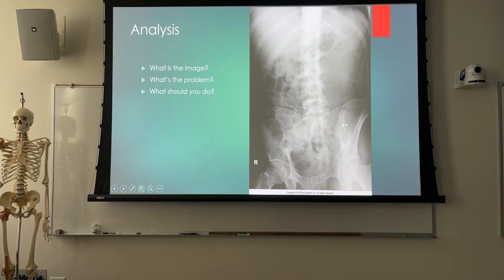We look at the pelvis, and in the pelvis we can look at a lot of different stuff. We can look at the obturator foramen. The one on the side closest to the image receptor, where we're rotated towards, will be scrunched, and the open one is going to be on the elevated side. We can see the pretty good SI joint here, right? The iliac wing on the side closest to the image receptor is going to be flattened out, and the one on the elevated side is going to be more vertical.